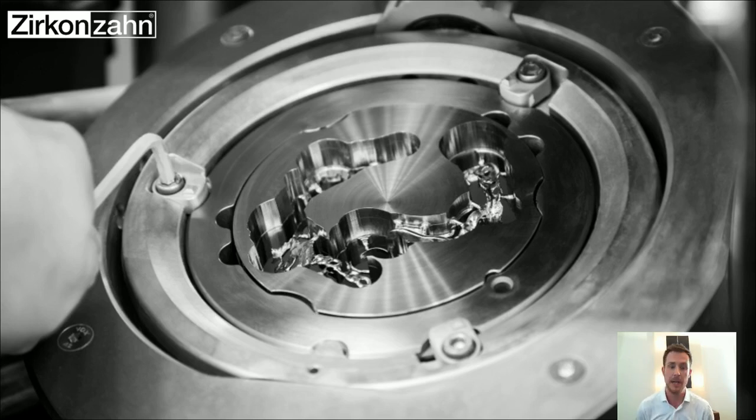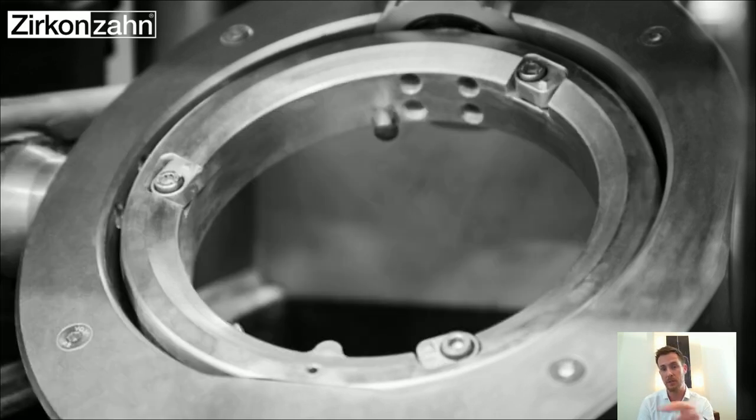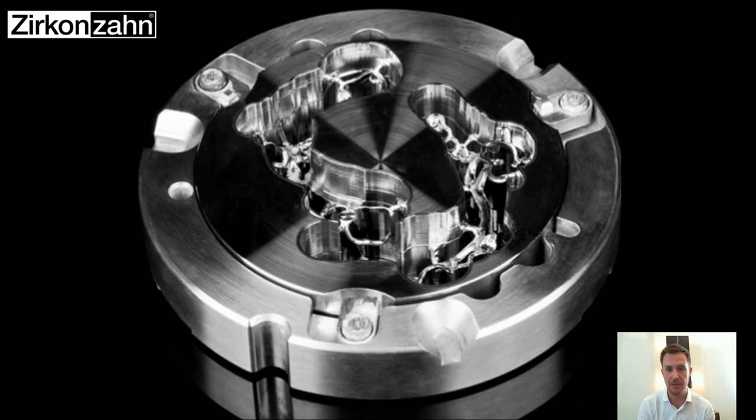Or if somebody wants to buy a new milling machine, we provide a kind of removable orbit with our new milling machine called M2 or M2 Dual. This milling machine has an inner orbit, as you can see, and this inner orbit has specific anti-rotation points to replace the inner orbit again in a perfect position if you need to take it out.